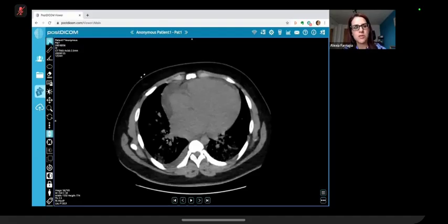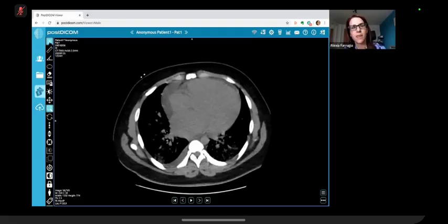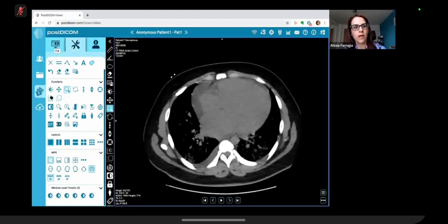So this patient had an echo and was found to have a decreased ejection fraction of less than 40%. Don't forget, he's a 19-year-old. This was dilated cardiomyopathy, in a patient who presented with pulmonary edema. So the diagnosis was made on echo and on CMR.